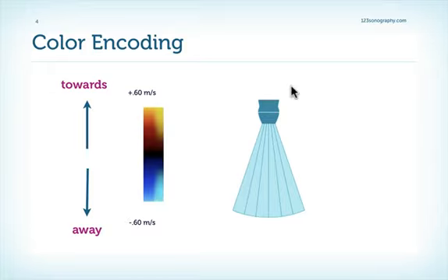Now, beyond these conventional rules, there is still a very high variability of how color flow can be displayed. And each machine, each vendor, has several different maps that one can use and display color. So in a way, you always have to get used to how flow looks on a certain machine. One thing, however, which is very important is that each of these maps also has an upper limit. This is the so-called aliasing limit. Remember, in the chapter on Doppler, we talked about the importance of the aliasing limit, the Nyquist limit. Well, this limit is displayed also on the screen.